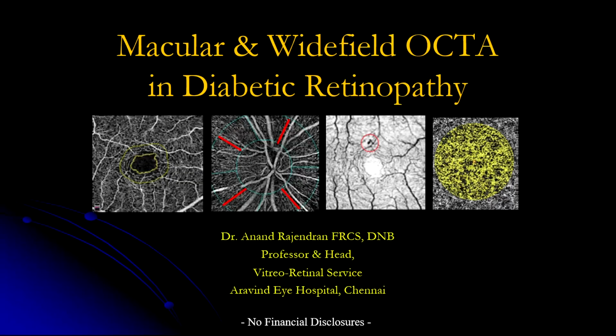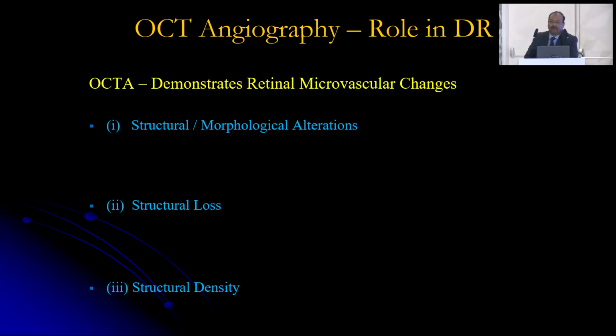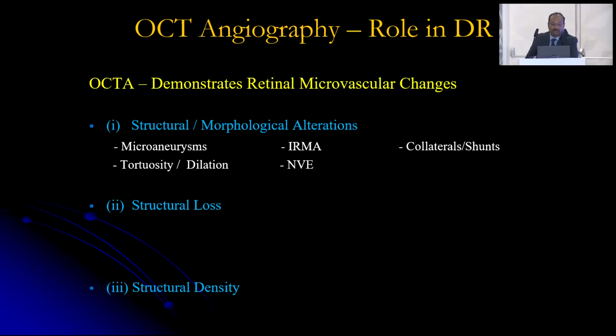So it's my pleasure to talk to you about macular as well as Widefield OCTA in diabetic retinopathy. The role of OCTA in DR primarily demonstrates retinal microvascular changes, be it structural or morphological alterations like microaneurysms, tortuous dilatation, IRMAs, NVs, and collaterals.